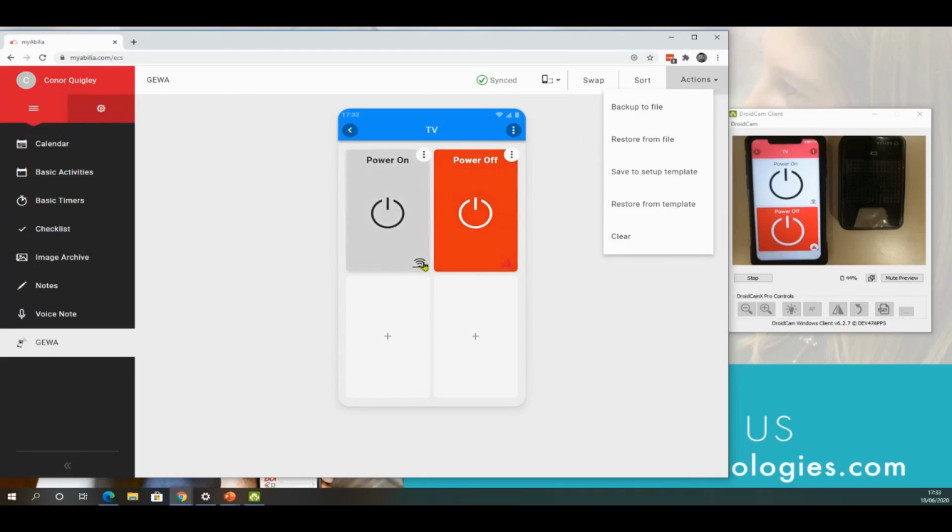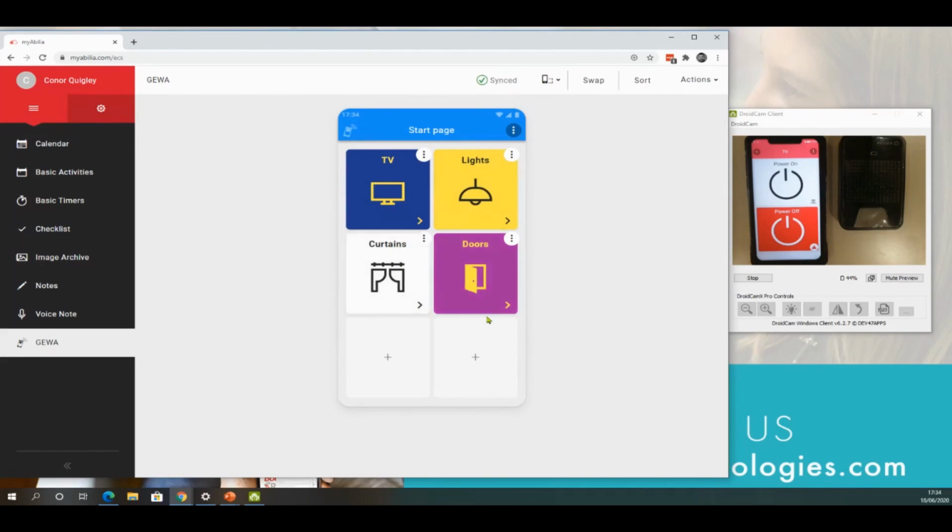And when I back it up, it takes the IR code with it. So say, for example, I could have a page here for a skybox, we'll say, which is a popular satellite box here in Ireland. So I may have a number of users that have skyboxes. I can create a page, I can back up all the IR codes. Then if I'm working with another client and they've added a skybox to their system, I can simply pull the page in. I have all the editing and the remotes done, and it takes me 5 minutes instead of having to drive to their house, program in all the buttons. I can now remotely support them. So there are some of the features on the remote syncing and the remote editing of the Gewa 1.